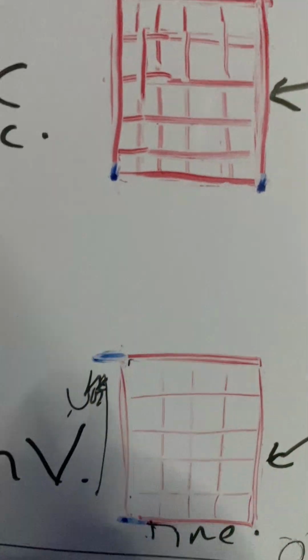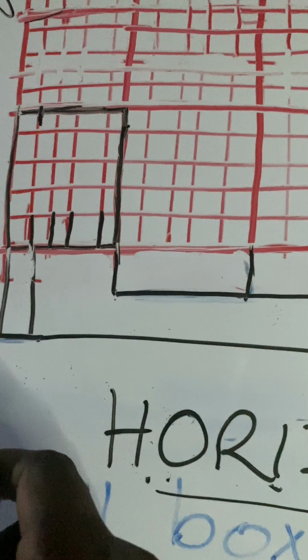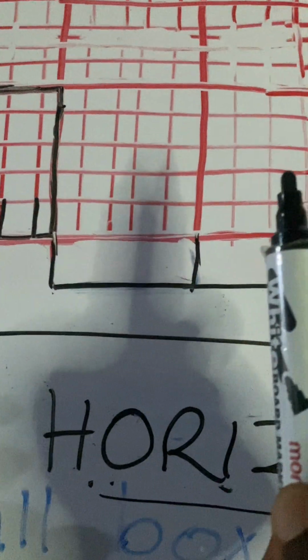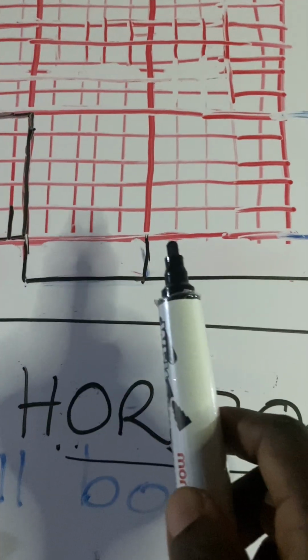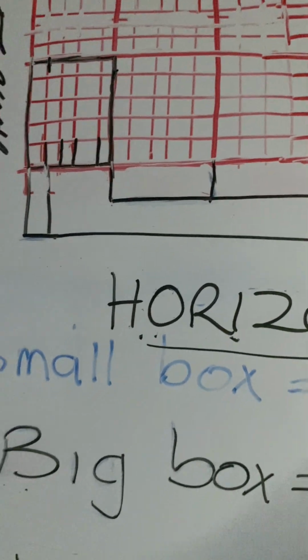Okay, so far we've been saying that when you take an ECG paper, on your vertical axis here, you have your voltage or your amplitude, okay? Then on your horizontal axis here, we have your timing. Let's keep that in mind. This is very important because it will help us to understand our waves better, okay?